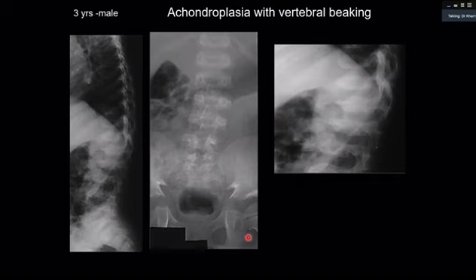So I have given you the diagnosis in this case, but just as a practice, can you give me the findings? Can you describe the findings? Because this, again, is an exam case.